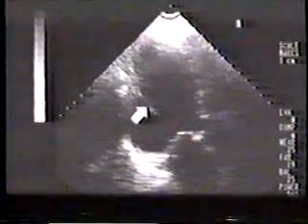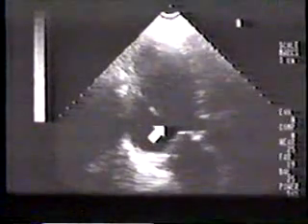You can see that the papillary muscle has also been infarcted. It is thinned, echodense, and stretched across the neck of the aneurysm. Such patients usually have associated significant mitral regurgitation. Furthermore, if a decision is made to resect these aneurysms, the surgical procedure will usually have to involve mitral valve replacement as well. Note the severe reduction in LV systolic function.